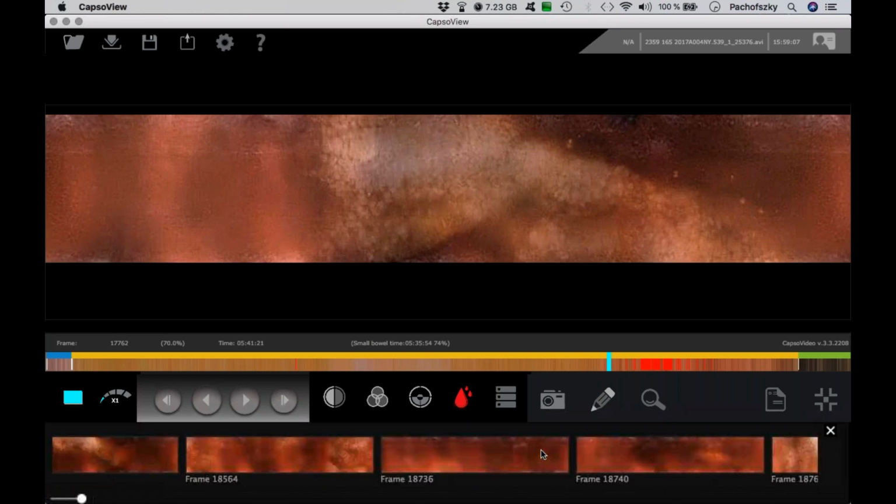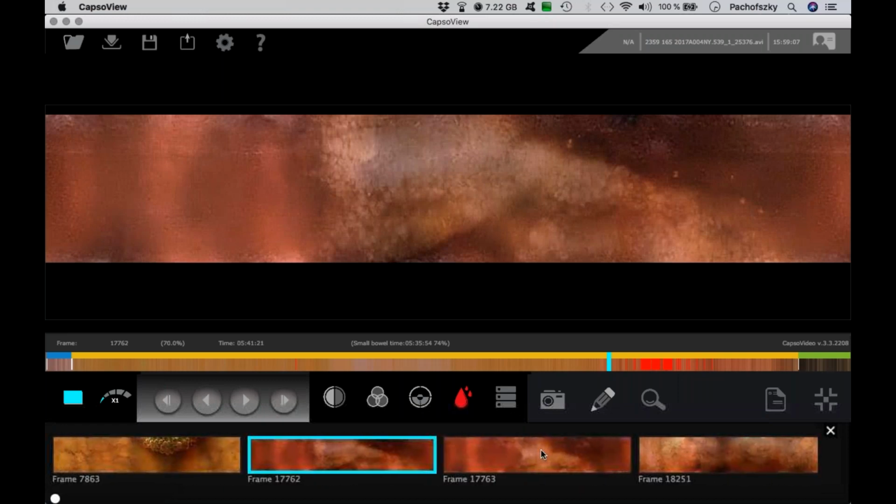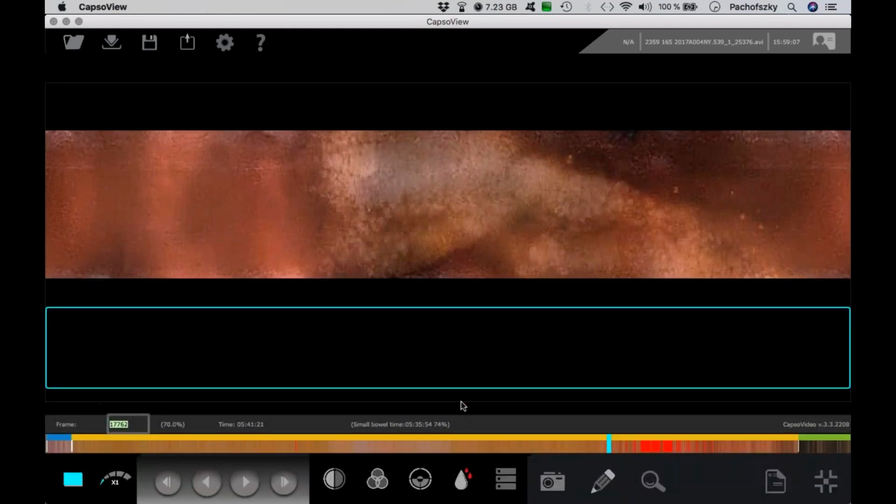So we have a lot of red in this. So we have an ongoing bleeding, and before we start with the examination, you can see with this item, okay, there's an ongoing bleeding. We know where it will start, and we can say, okay, we look here first what's going on. But I will close it.